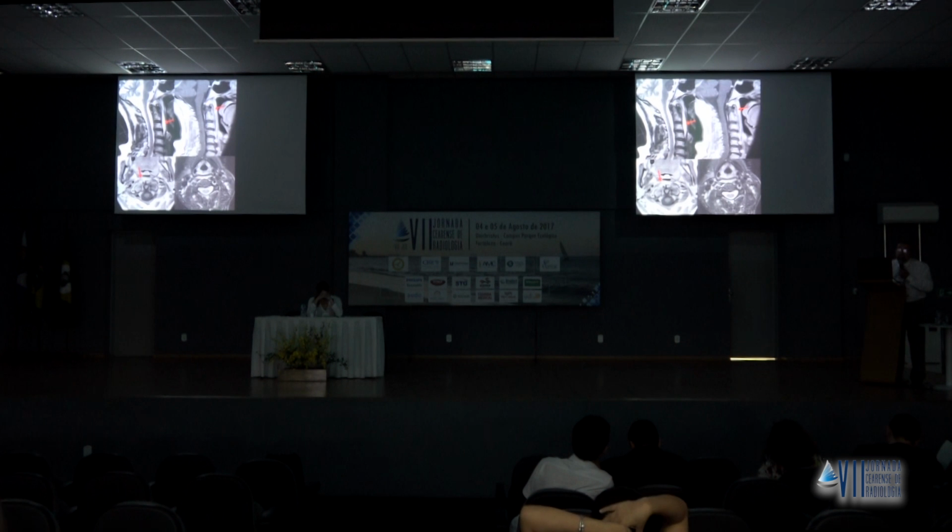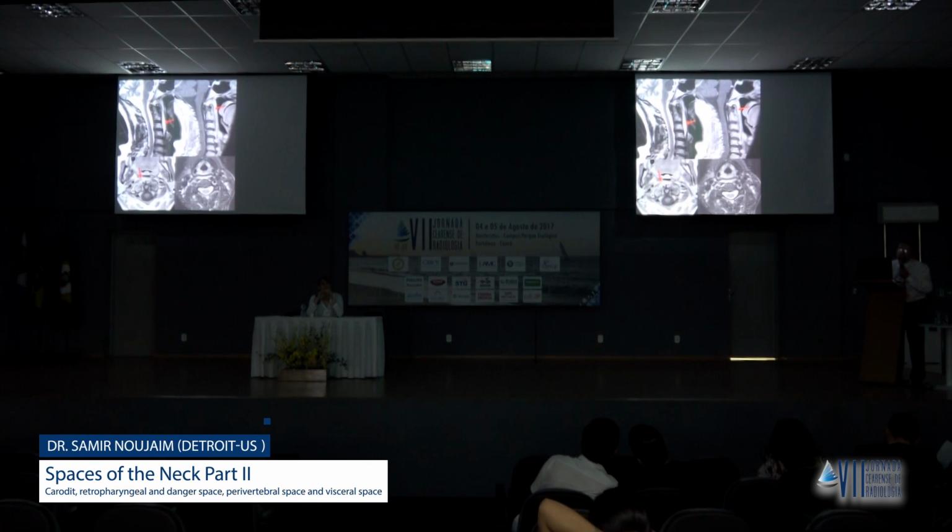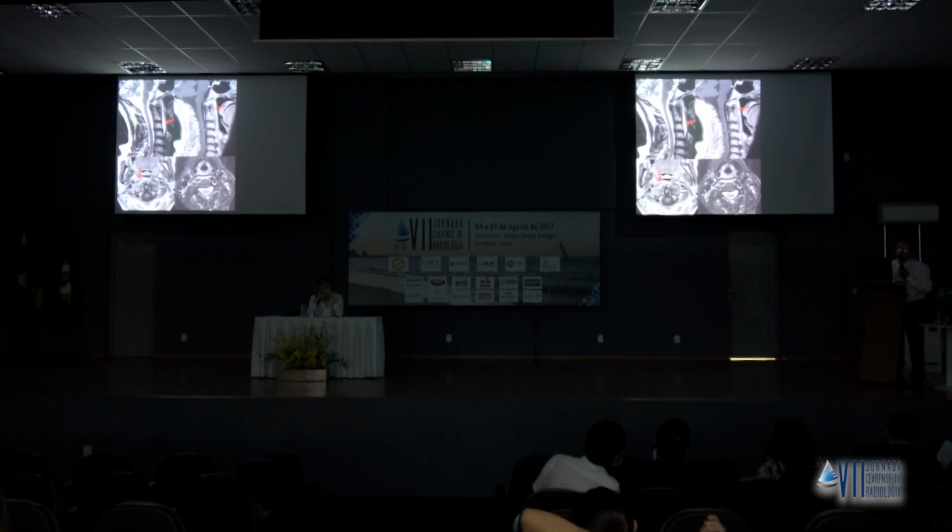And the other condition I want to discuss with you is this patient that presents with odynophagia, low-grade fever, and a lot of neck pain. We did MRI, and you see this thickening of the prevertebral space with edema, and there's a low-density abnormal signal here, and you can see the edema in the retropharyngeal space, but there is abnormal longus colli muscle on this side, enhancing with contrast compared to the other side.